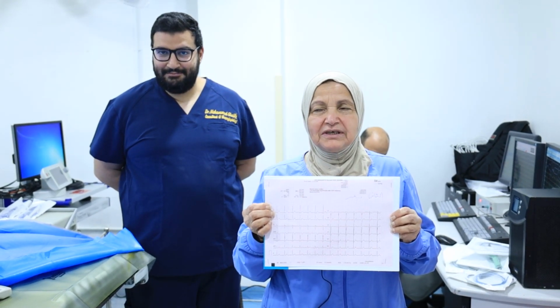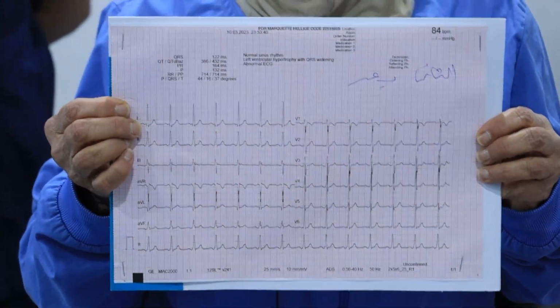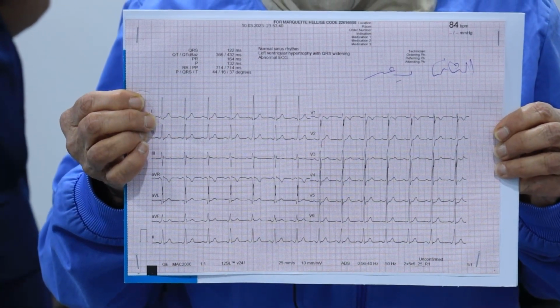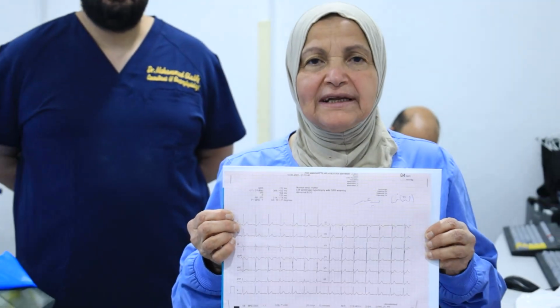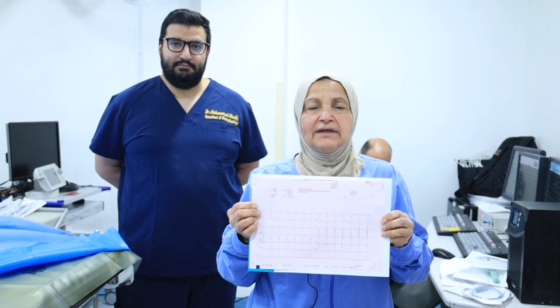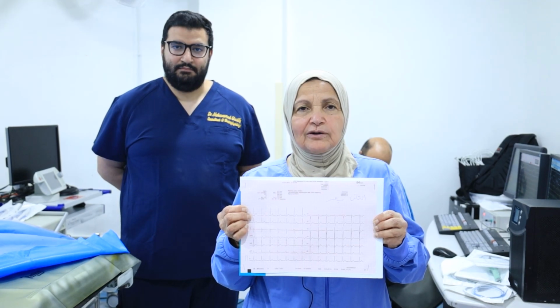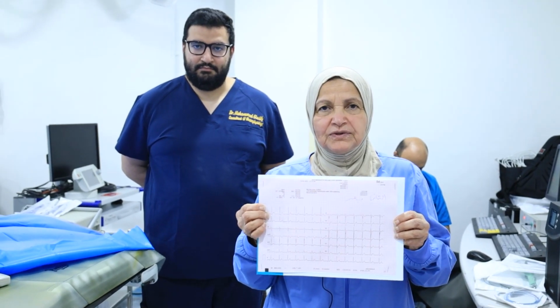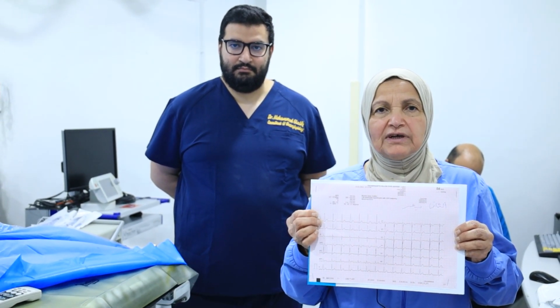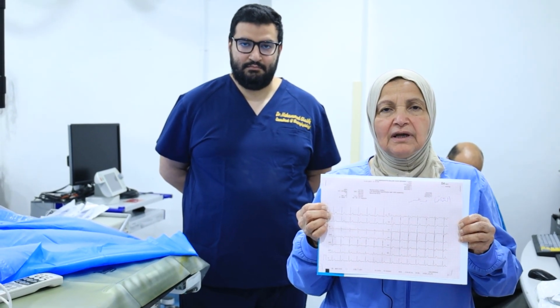As you see in this ECG, this young gentleman is an 18-year-old man who presented with recurrent palpitations, and his ECG was like this, with a normal echo and no family history of any similar cases. Actually, in the clinic, one of the team diagnosed this as an anteroseptal accessory pathway, and when explaining the risk of heart block to the family, they preferred to do it with 3D mapping.